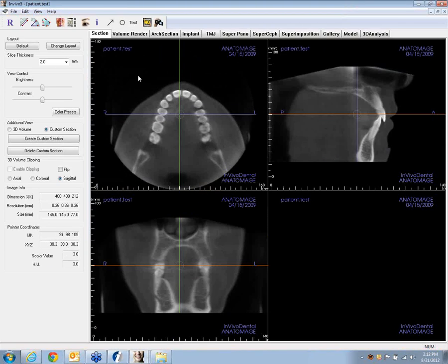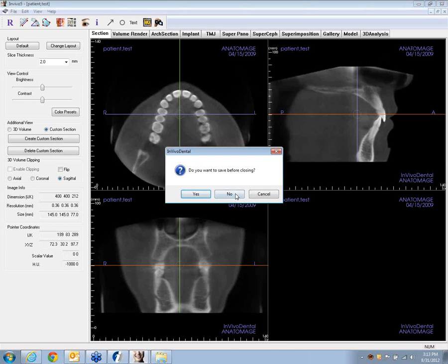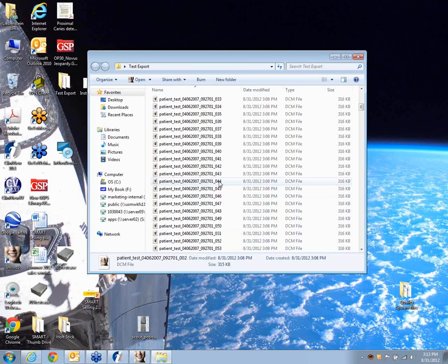And we see here that in my file viewing software, we can see the date that it was taken and the patient's name, and all of the data that's embedded in that image is going to be shown up on this file here. All right, now I'm going to close this out so that we can see the difference when I go to the anonymous data.